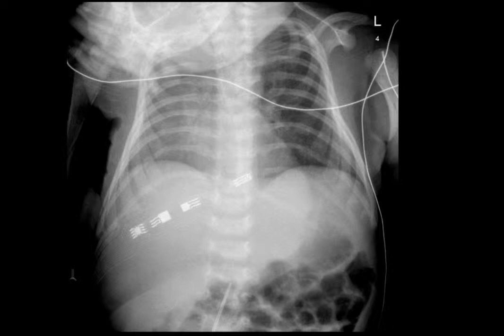So this first patient is a patient that had cardiac surgery recently and was recently extubated, and you can see there's asymmetry of the lungs with the right appearing much more opaque than the left. And this is just generalized atelectasis involving most of the right lung. It's not complete collapse because you can still see there is some lucency there. If it was complete collapse, the density of the lung would be the same as the liver.